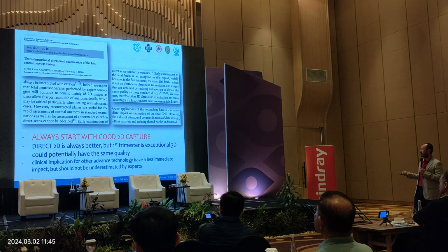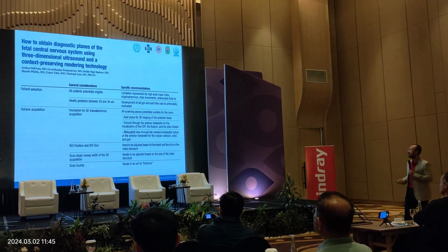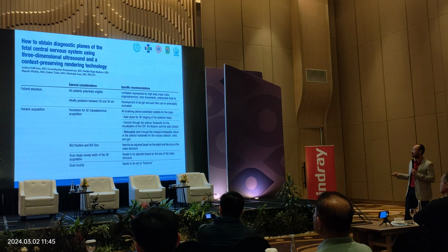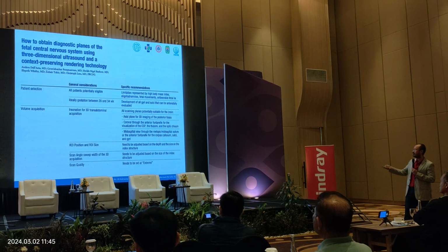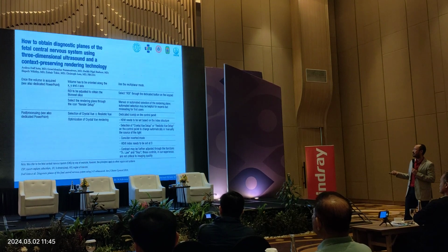The clinical implication for advanced technology is still less immediate, but should not be underestimated by the experts. And this is the newest standard from the ISUOG. You can see here, very clear, the step-by-step.